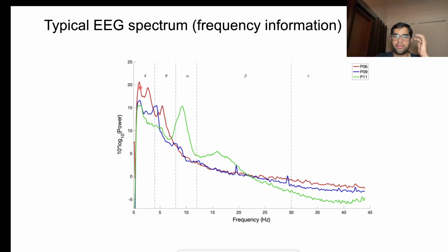Or you can fit an exponential and do a reverse of that, so that it becomes flatter, and you don't miss the important blips here just because of noise. When you do a normalization everything becomes flatter and you see a peak like this.